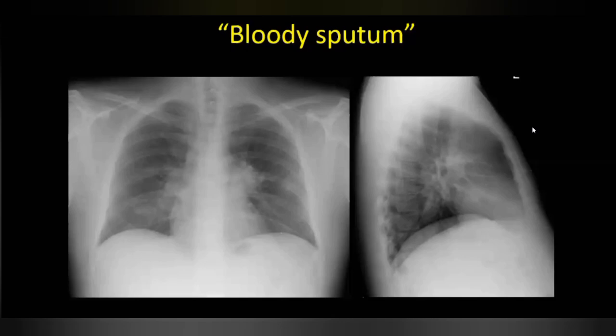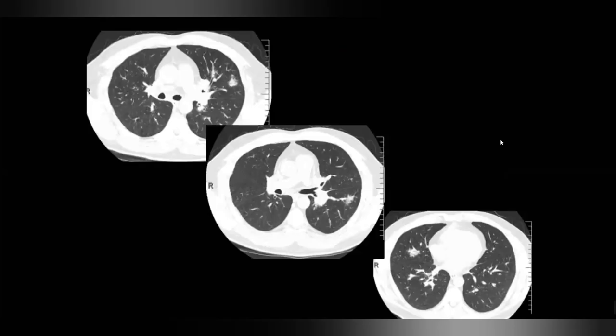And next, I would like to go for a contrast-enhanced CT chest, and I would inform the findings to the referring physician, and we'll discuss the further management. So what kind of CT scan do you want, with contrast or without contrast? I would go for contrast-enhanced CT. Unfortunately, we have this CT without contrast, but anyhow, it will serve.